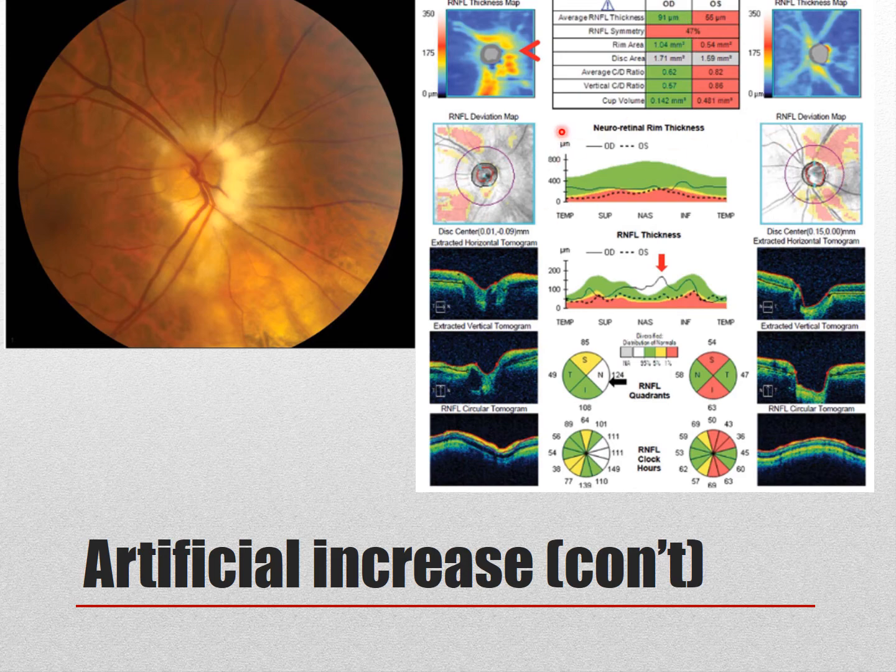Is it a true red disease? Let's see. Here where it is thick, because of the nerve fiber, you don't see any loss, but you do see loss here and here, and the same thing over to here and here.